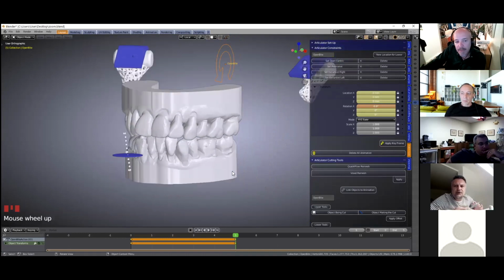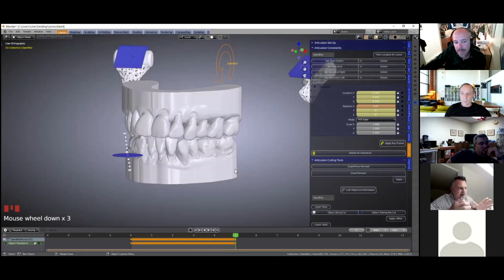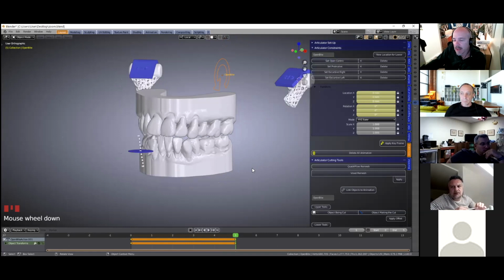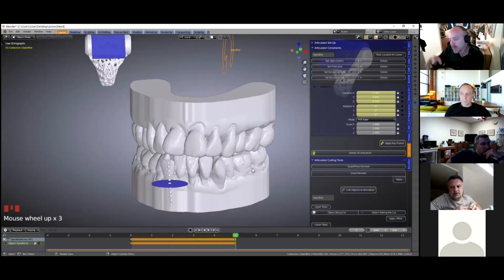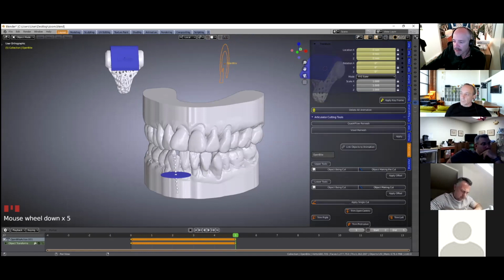So you don't need to make the move again in the click regarding the articulation, also if you change the vertical dimension. Once you do it, it's done. Yeah, once you've set it, it's done. It's like in the laboratory, you've got the articulator, you've set it, you've opened up the bite and everything. It's done. Yeah, good.